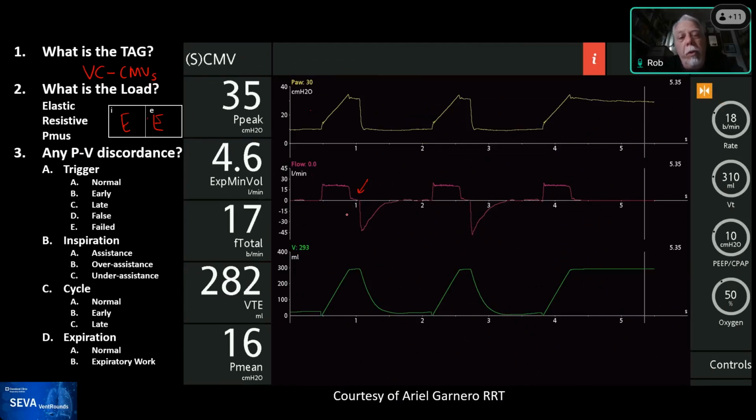And yeah, two things I could think of. One, I suppose conceivably this could have been running on its compressor, right? Not on the wall air. So in other words, any ventilator that has a blower will get a slightly distorted flow waveform with a very high load. But the other effect may be simply that for the first few milliseconds of inspiration, you were just filling up the patient circuit because the airway pressure was so high, and then once you filled it up enough, then it started giving you the flow that it was set.